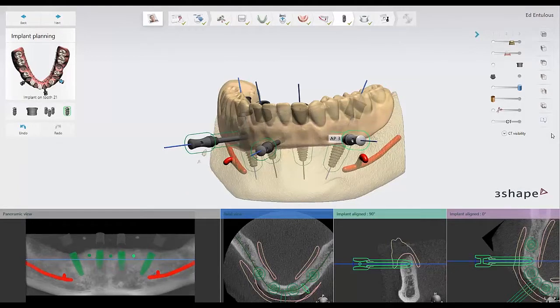I will even add my comments to our surgical reports when we output that. So the idea is that it's first for documentation, but also to have a tool at hand for interactive communication with your fellow co-workers, both on the clinical but also on the lab side. It can be used in the different steps, so it's a very flexible tool. So let's move on to the last step, the guide design.